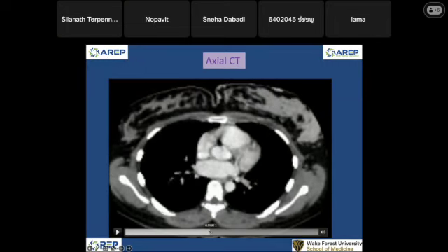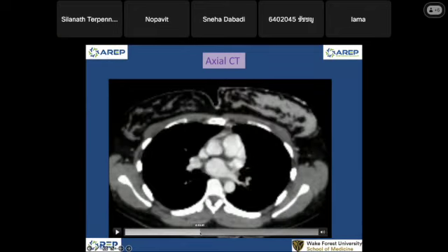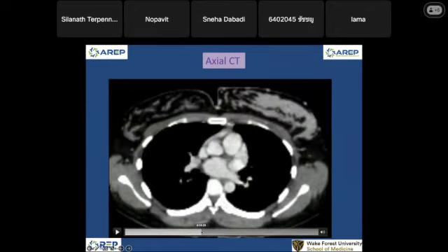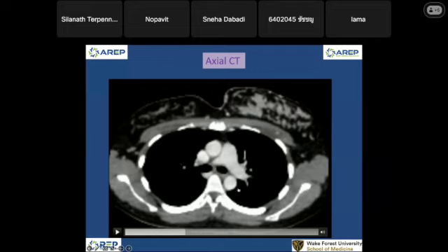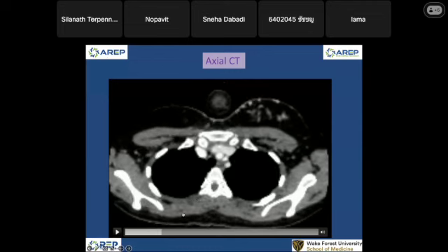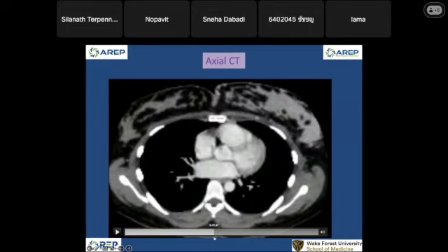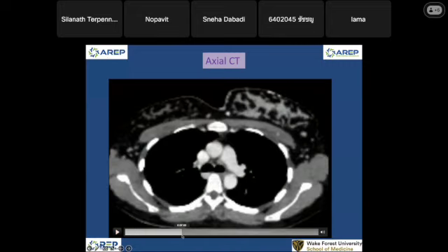Going to the aorta, this is my aorta. After that, it becomes the aortic arch, coming up here. This is the aortic arch. And then coming down, it becomes the descending aorta. So we have all vessels complete. This is the three branches of the aortic arch: right innominate, left common carotid, and left subclavian artery. So this is our brief vascular anatomy of the lung here.